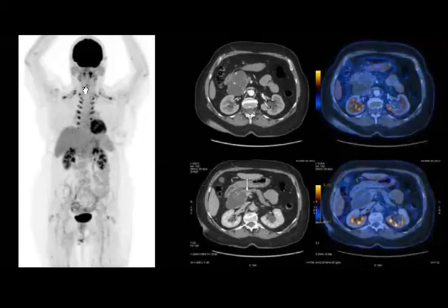Nice answer. So this is brown fat, so it's not metastasis. Not because you just find a pancreatic lesion will everything in the body be metastasis. No. And again, you can find the normal physiological excretion of the tracer through the bladder, and the heart and the brain, we always talk that it is physiological uptake. So it is not a bone lesion, it is brown fat, along the paraspinal and supraclavicular region.